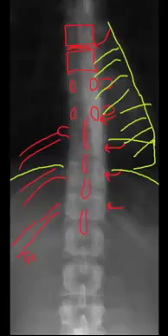Typically, on a thoracic spine, you will have a slightly wider collimation, which will allow you to see varying amounts of the ribs, lung tissue, and maybe even to the lateral chest wall margin. So, if you can see more of those structures, that's great. However, we're going to do a chest tutorial in which we'll identify the more peripheral structures around the spine for your viewing pleasure.